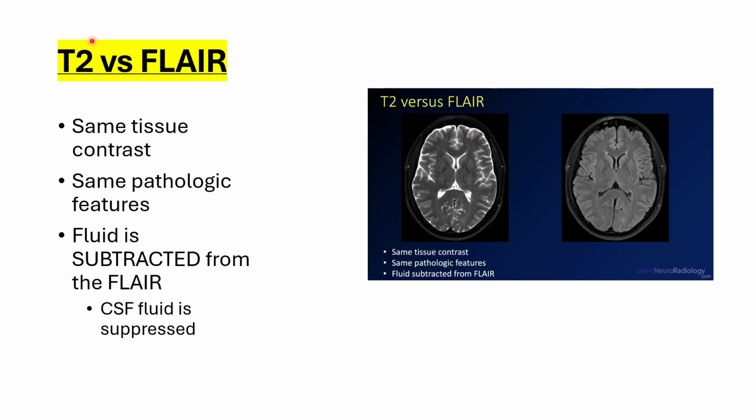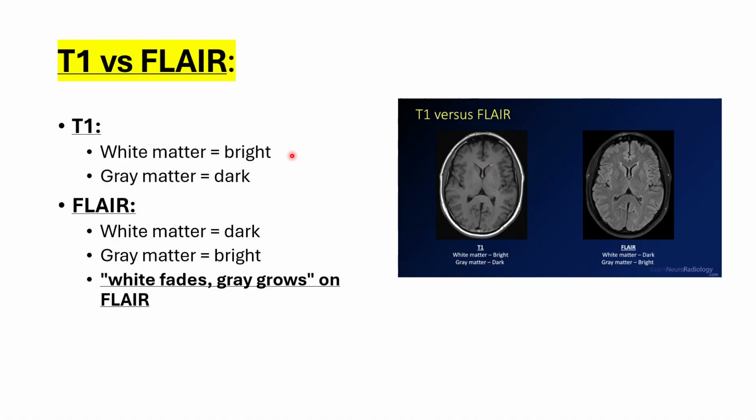This is looking at T1 again, which is for looking at anatomy mostly, and then FLAIR.